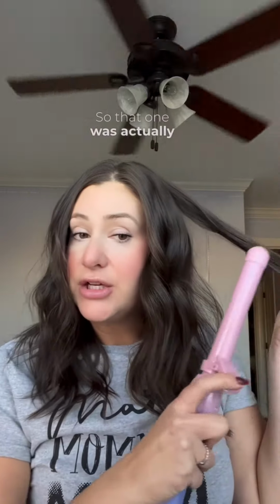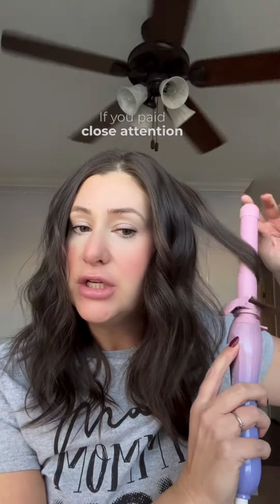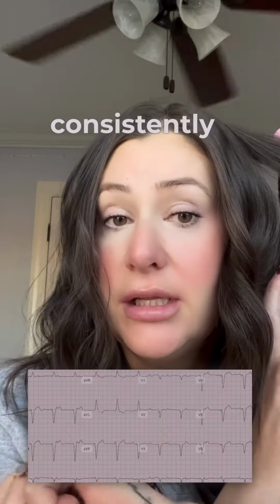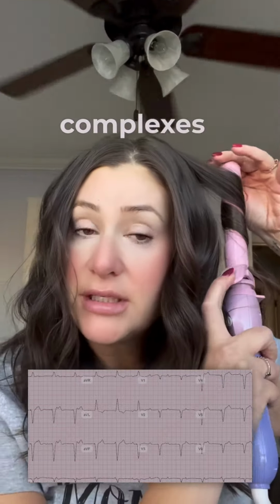So that one was actually a 3rd degree heart block, or a complete heart block. If you paid close attention, you would see that all of the P waves march out consistently, all the QRS complexes march out consistently. However, there is no communication whatsoever between the atria and the ventricles. This is why we call this complete heart block, or complete divorce between the atria and the ventricles.